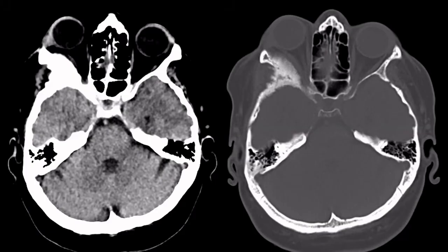This patient presented with a chronic proptosis, slowly progressive. This is a line drawn between the most anterior aspect of the zygomatic bones. We call this the interzygomatic line, and we see that the right eye is located almost completely in front of the interzygomatic line. That's not okay. This is a proptosis, and I'm going to show you how to classify proptosis on images in a minute.